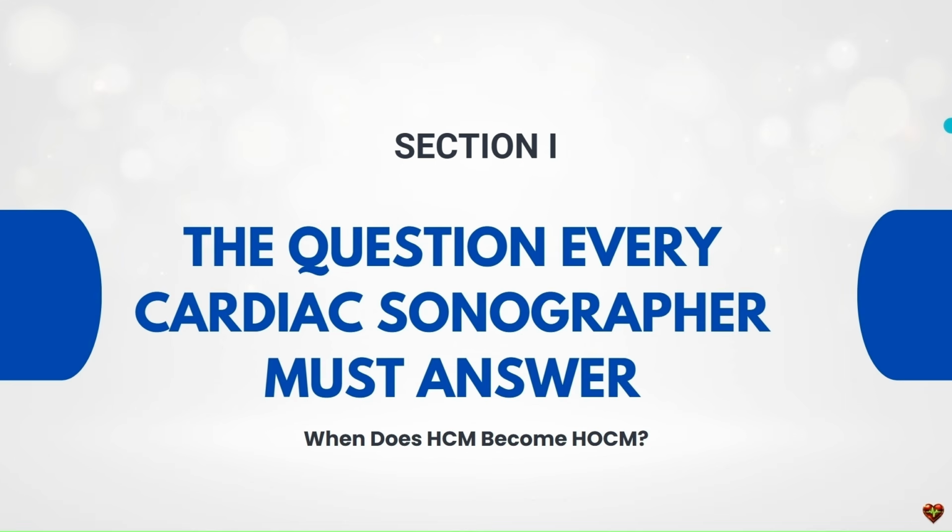By the end of this lecture, you'll know exactly what separates HCM from HOCM, how to recognize obstruction in echocardiography, and how to evaluate these patients using a systematic approach you can apply both clinically and on your registry examinations.